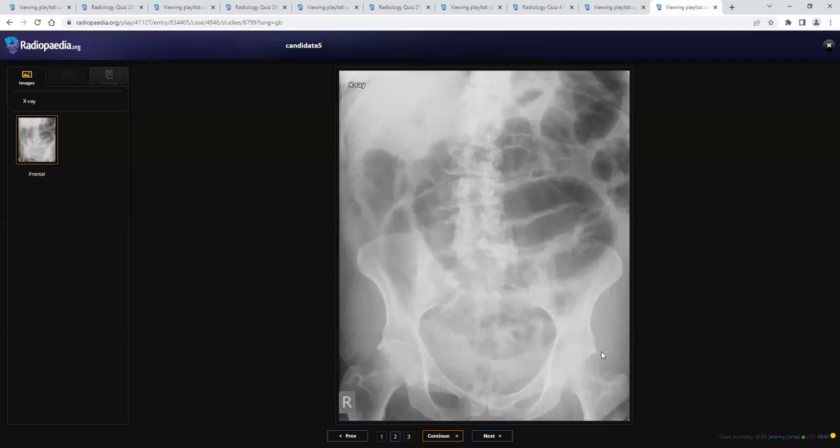I'll review again to see if I can see any definite signs of pneumoperitoneum on this. I cannot. There is this faint lucency in the upper abdomen, which does not conform to definite air within the bowel. There is strong clinical suspicion of a perforation. I can confirm further with erect or lateral shoot through to confirm if there is any perforation.